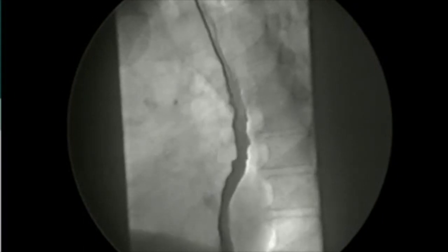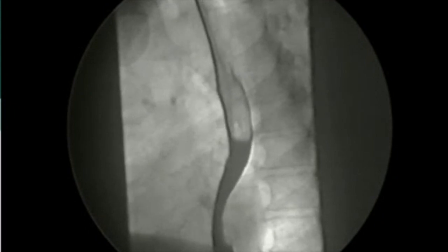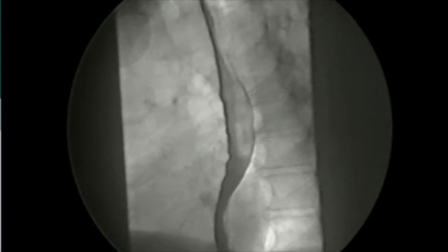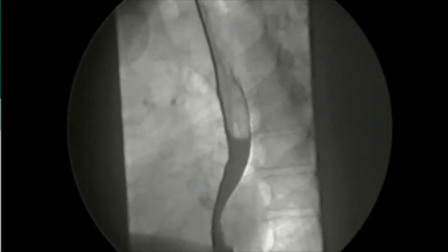The esophagus, which is basically a tube mostly made up of muscle, is first moving the barium downward just fine, but then, at some point, goes into a spasm, which looks like a corkscrew, and makes it difficult for more barium to pass downward. When the spasm occurs, the patient has a sensation that food, or in this case barium, is getting stuck.